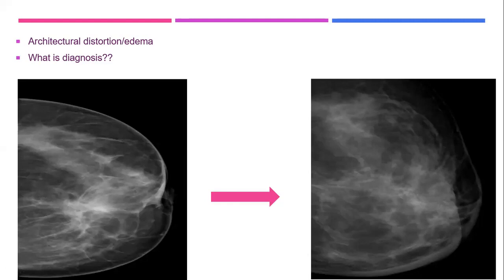What is the significance of that? So it's either disease progression or consequences of the intervention. If it is acute, and I mean, if the image taken shortly after the surgery. No, this is post-surgical, Abir. You have done this case before, and in an excellent way. I don't know why now you are confused. That is why I said the first image is for you, pre-surgery.